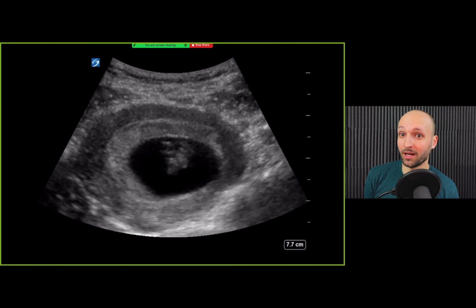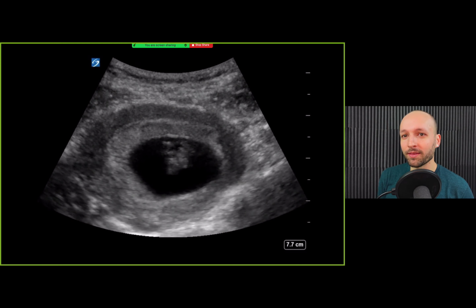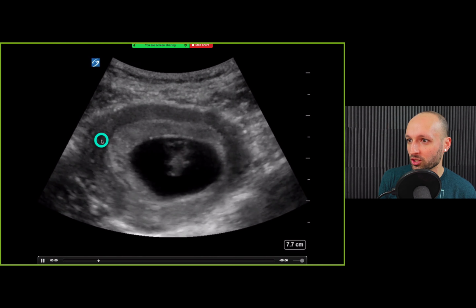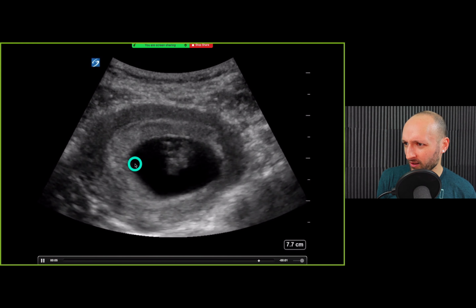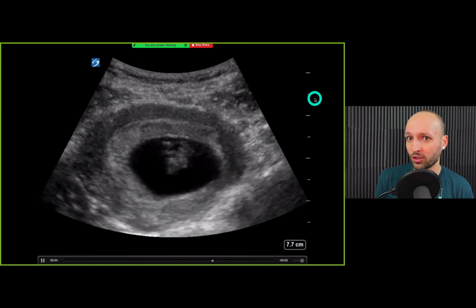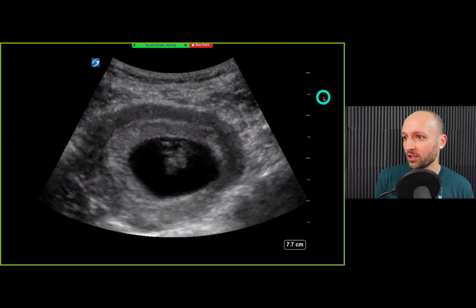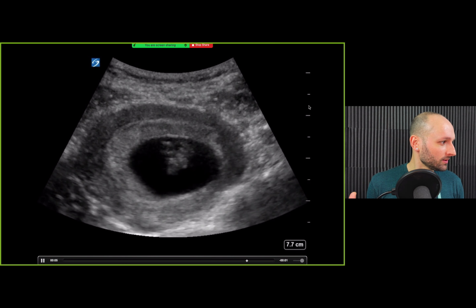Now, what do you guys see here? What is going on? Clot somewhere. Okay, that is great. So, thank you for that. He's saying this is maybe a clot. And I think that maybe he's saying that because there is a circular structure here. And then we're seeing like an open kind of lumen right here with a little thingy in here. I can definitely understand how that could be a thing that you might think. What if I told you that this was not in a blood vessel?